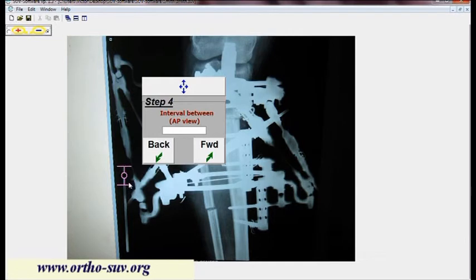To do it, we have to press the left button of the mouse at the T-shaped intersection of the pink lines of the dumbbell and, holding the button pressed, drag this intersection to one end of the ruler. Then we do the same with the second end of the ruler. To be sure that the ends of the dumbbell and the ruler coincide, you have to check it on high magnification.